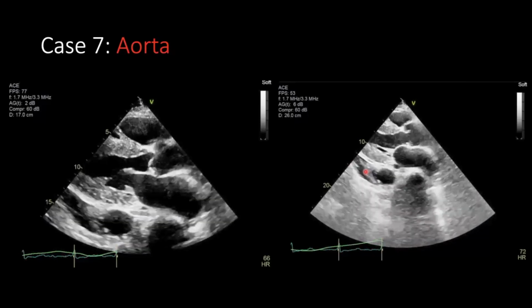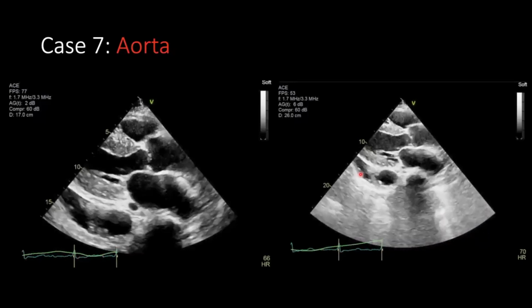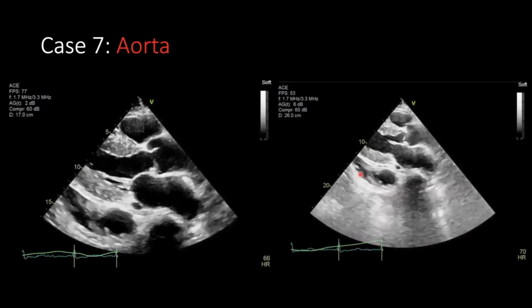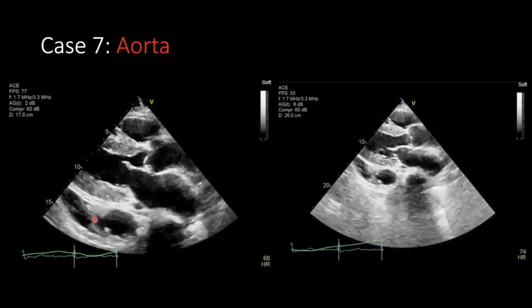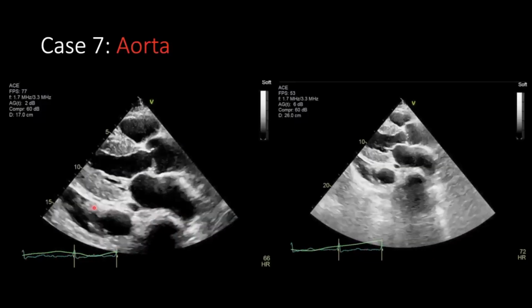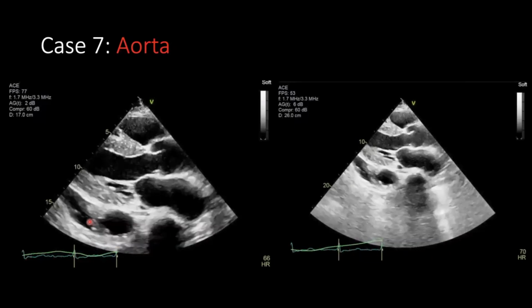So what do you mean over here? Yeah, it's possible that they do have a bit of a small pleural effusion. I know I gave you guys that option, but actually this could just be a mirror artifact too. But I think it's a loculated pleural effusion. Yeah, it's a pleural effusion.